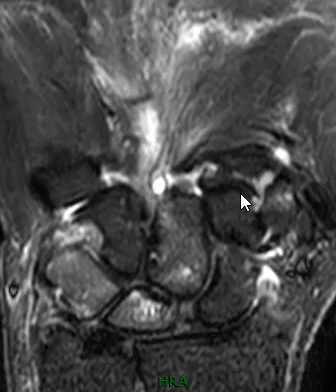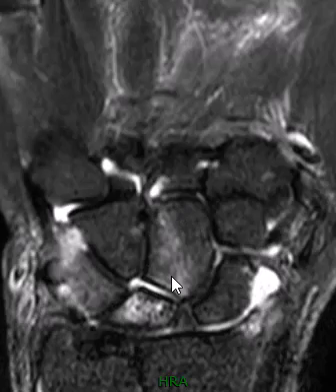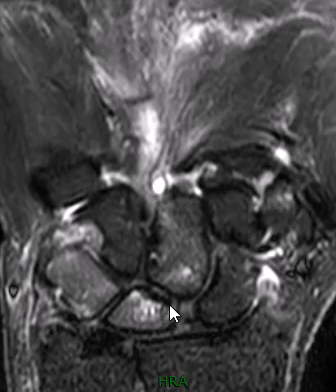This is a fat-suppressed T2 or STIR sequence here. We can see there's also some reactive marrow edema within the capitate bone, so some stress-related changes. And that also could be seen with rheumatoid arthritis and just the proximal migration and joint space narrowing. And also here, the triquetral bone had similar marrow edema, but the lunate bone has the most marrow edema and also that low signal on the other sequence, which is probably some reactive fibrotic changes on top of the marrow edema. But no collapse at this time.